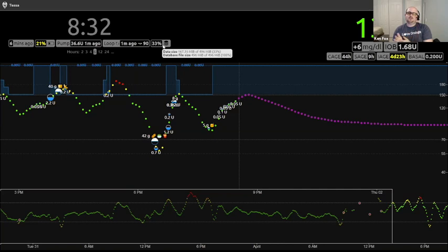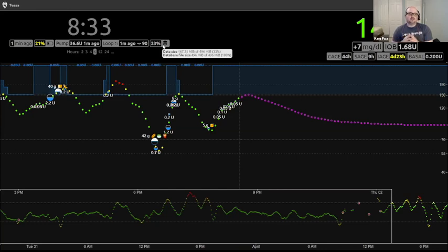This is a database pill you can turn on, and it tells you the size of your database, which is 167 megs of almost 500. And then the whole database file size is just the disk space. Don't worry about that one too much. But when it starts getting close to 500 megs, that's when you start looking at that whole MLab cleanup thing. Maybe you guys have seen in the Facebook group. You get to clean up your Nightscout data, which we can touch on if we have time.